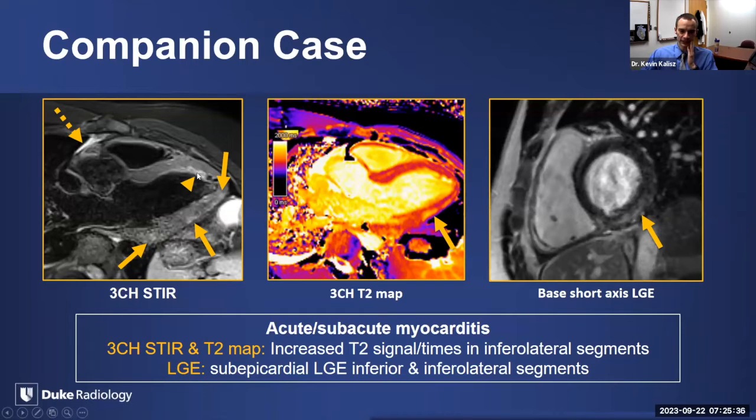This here sometimes gets confusing. This is actually still within the cavity of the left ventricle. This is actually a little bit of slow flow artifact. This is not actually myocardial edema. And then, albeit not specific but supportive, we do have a little bit of pericardial effusion here.